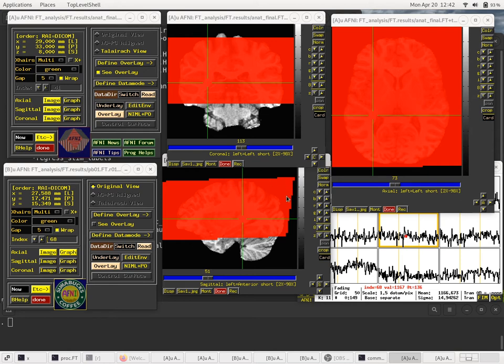So since that's not a right angle, it looks to me like some of this has been chopped off due to head motion. For example, this side over here, the subject nodded their head. So maybe this could be chopped off over here, or the top and bottom, I don't know. Whatever. Something gets chopped off, possibly multiple regions get chopped off a bit due to that head motion.